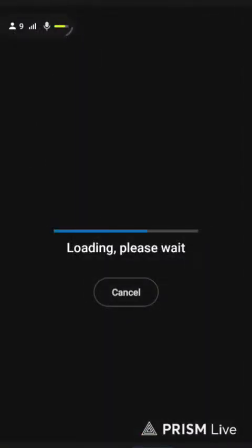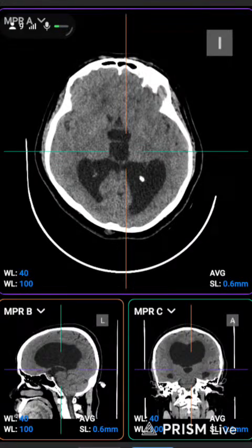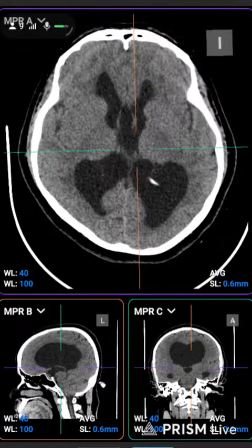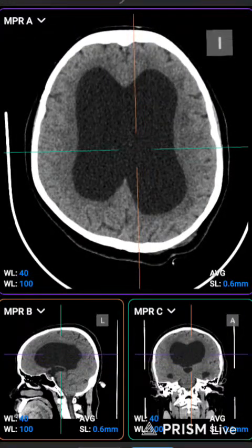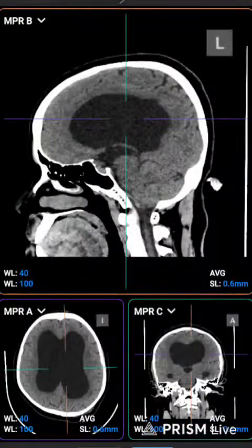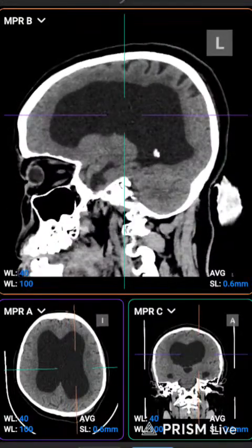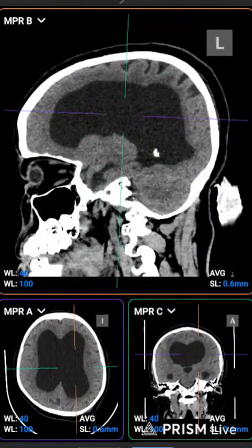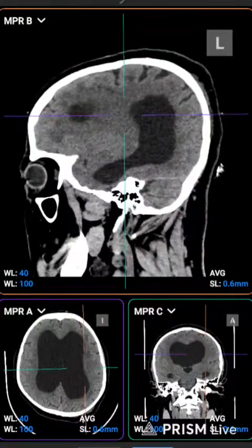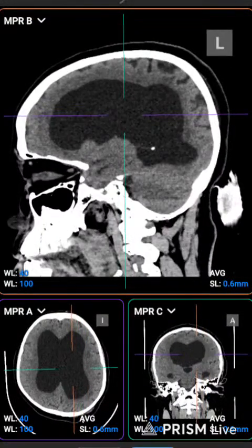If we add more slices in 3D, the coronal and sagittal views are better to see, because there are lots of details in every slice. In the normal patient the ventricle is not that large, and this one is full of CSF.